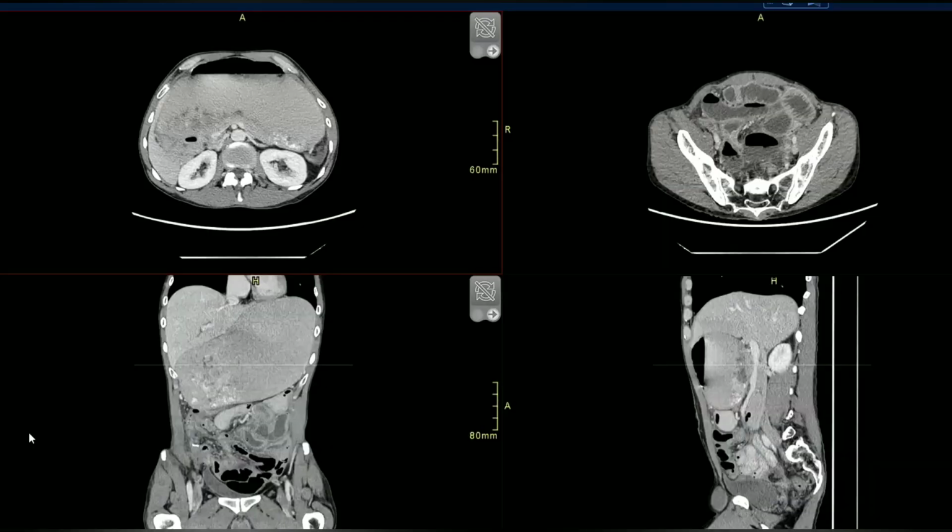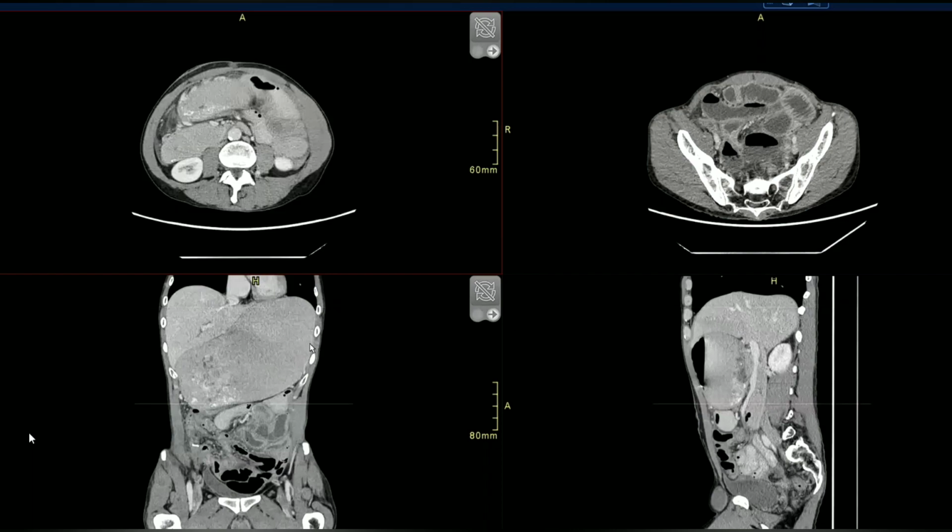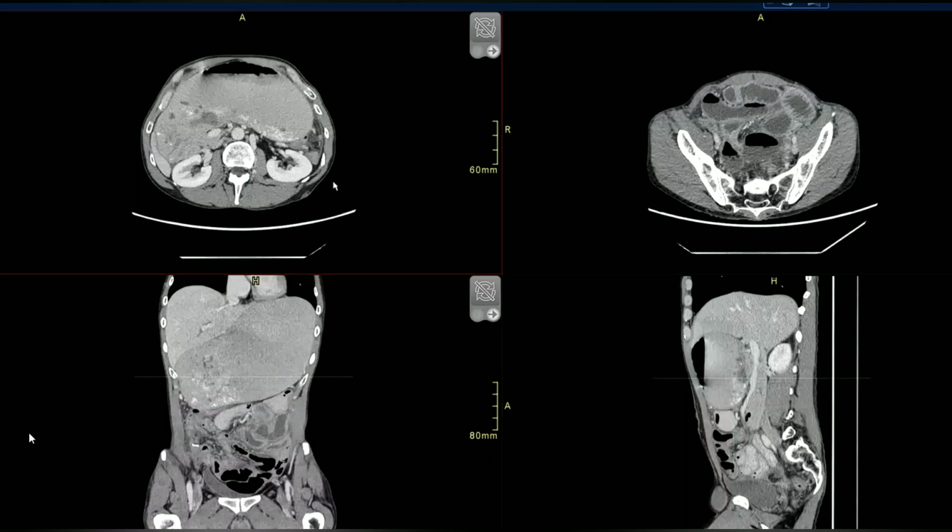Okay, this is a CT abdomen, post-contrast images, in which I can see that the stomach is markedly distended. Ma'am, please scroll again. I suspect a few specks of calcification in the posterior aspect of the stomach. I suspect these to be in the tail of the pancreas, however.